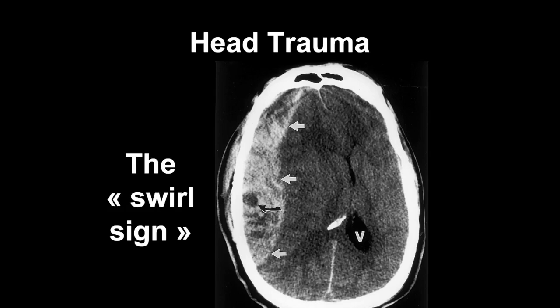Another thing that I also wanted to remind all of you is that there's a typical density associated with the age of the hematomas, typically the subdural hematomas, because an epidural hematoma, as we say, typically is going to be taken care of very quickly, and so will never have a chance to become subacute or chronic. On the other hand, subdural hematomas can become subacute and chronic, and typically the density of the blood starts by being hyperdense, and as time elapses, it becomes first isodense in the subacute period, and finally hypodense in the chronic period.